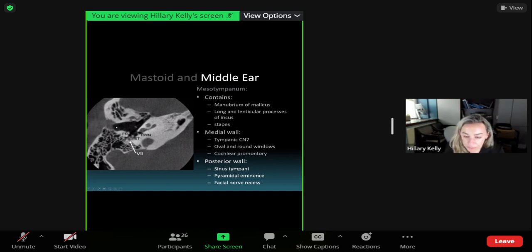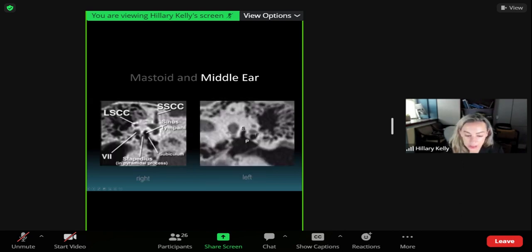There is a small bony ridge that separates, or is the inferior margin of the entrance into the sinus tympani, separating the sinus from the round window niche. And this small bony ridge is called the subiculum, okay, which again was something I was seeing in text, and I was like, what the heck is a subiculum? For us, it's not something you're going to dictate, but it is an important surgical landmark, okay? So if you come across it, essentially it's at the entrance to the sinus tympani.